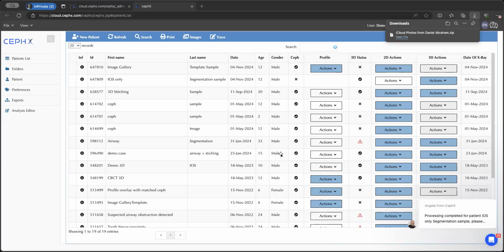This is a webinar on mastering CephX AI tools, different features and options we have within the system, both for existing users and for newcomers.